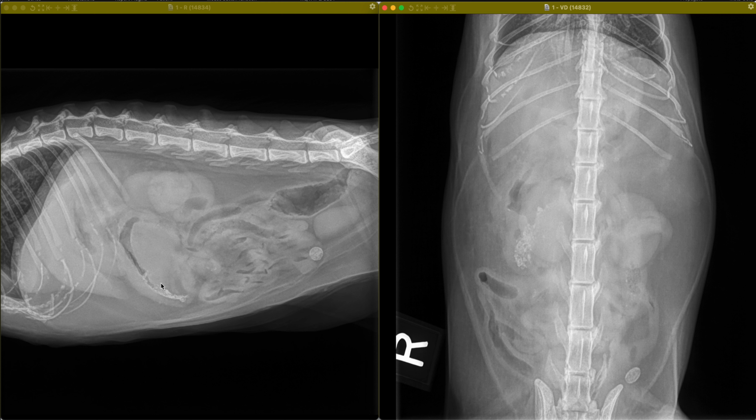We have also identified that there is hepatomegaly, and this is a nonspecific finding which can be correlated potentially to whatever mass is present, such as round cell neoplasia, or could represent an independent process such as a hepatopathy or cholangiohepatitis.